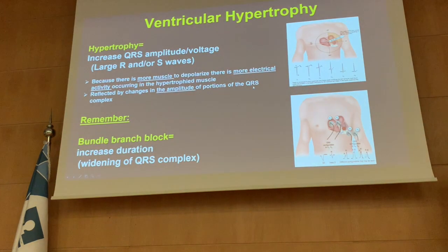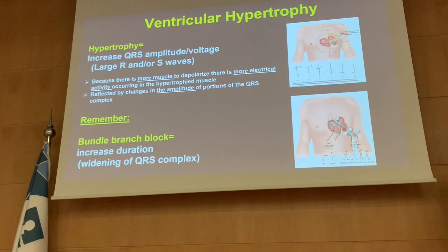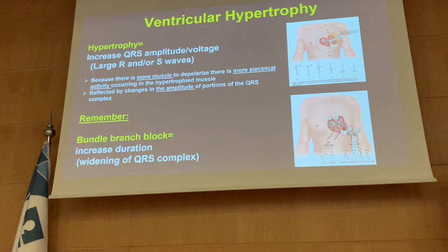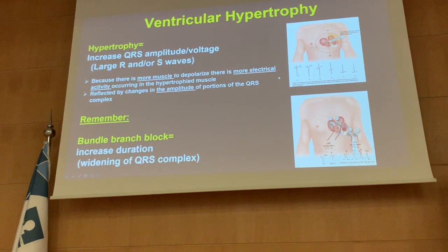Student: Doctor, how would we differentiate between just the left atrium and both atria? So by that, both of them are the same. You will have both findings in lead 2 and V1, provided the scenario. You have to read the scenario. We can answer this question if you have more questions at the end. But now we'll come to the important thing, which is the ventricle.